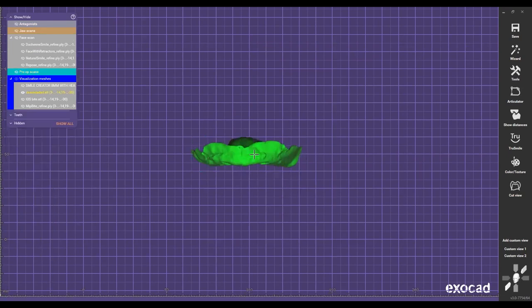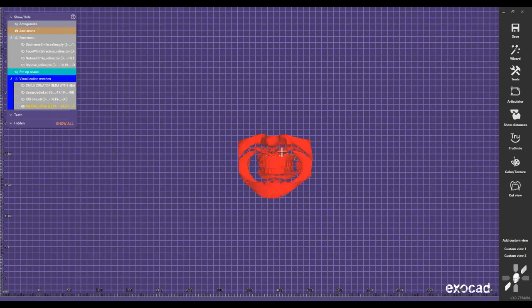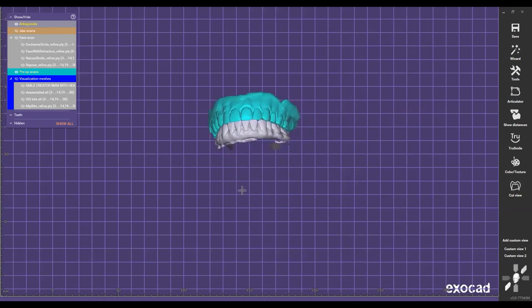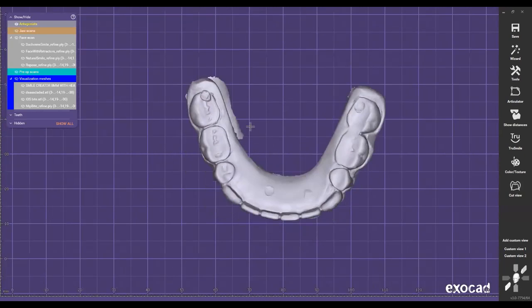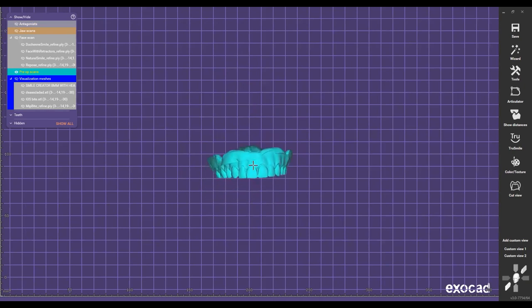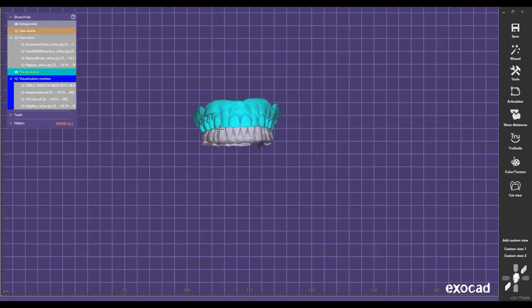There we go. So the records that we acquired for this patient were pretty much scanning the bite, scanning the pre-op upper denture. We did a wash right here, and then we scanned the lower. The patient already had a lower All-on-X case. I believe this is a conversion or acrylic with denture teeth as an opposing. And the patient was wearing an upper denture here, and the patient wanted to have a fixed screw-retained bridge on the upper. So he was tired of his denture. So we said, okay, we can help you. Let's get it done. So we acquired the intake records.